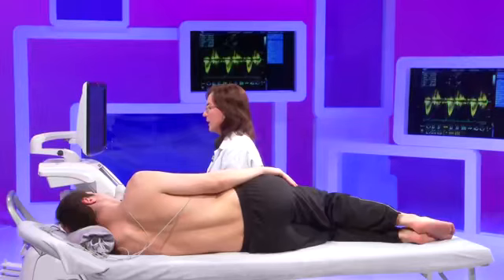So this is overall the semi-quantitative and quantitative assessment that can be done when scanning a patient with pulmonary regurgitation. The PISA method can be tried, but it is never validated as for the other valves, and there is no clear cutoff. This is why I have not presented it.